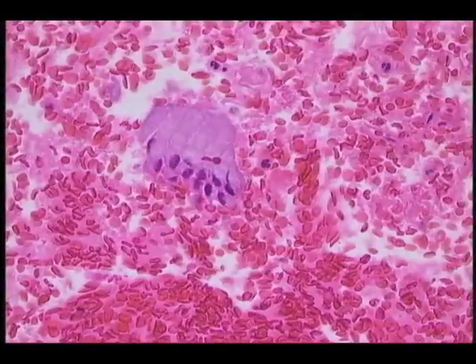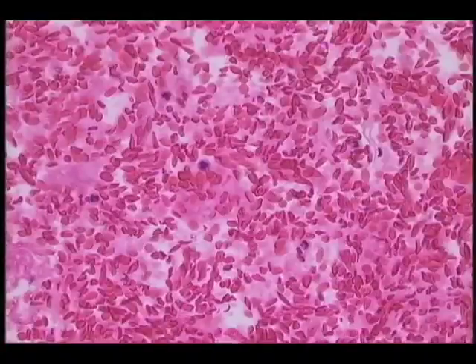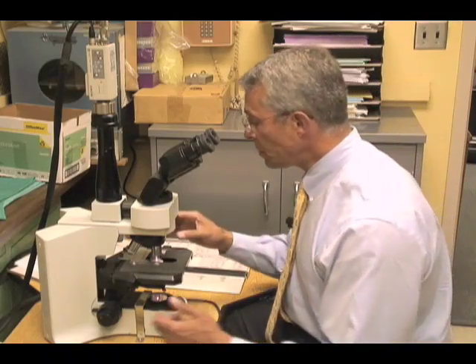In a sample such as this one, where the predominance of the material is blood and fibrin, one has to let the clinician know that this sample contains very, very small or sparse epithelial fragments, and that the sample is not diagnostic and probably was not taken with sufficient pressure, and did not yield diagnostic material. It is important to notify the clinician that their biopsy specimen did not yield a sufficiently adequate sample.